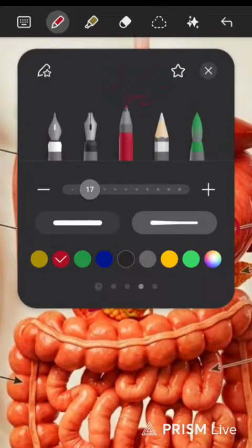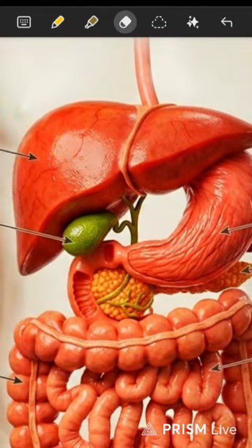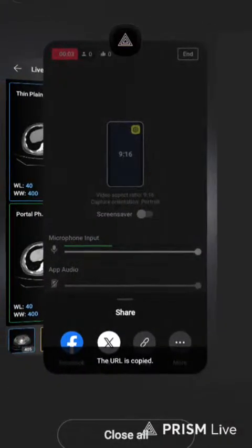I changed the color for better understanding. This part is called the cystic duct. Because the stone can be in multiple areas of the hepatic duct, you have to know the exact location of the stone, or where the problem is. From the end of the CBD, where the pancreatic duct connects, it's called the ampulla. So it's the brief thing, and now I go to the scan.